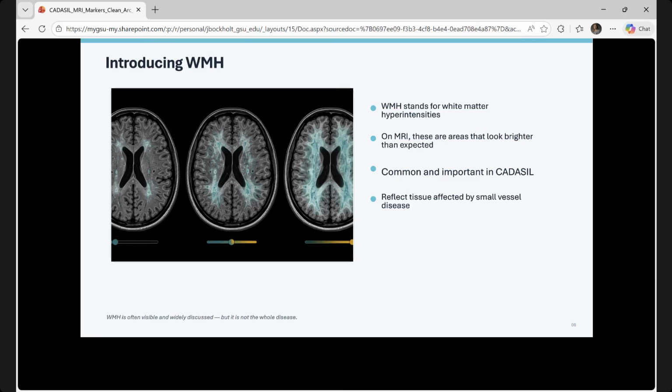So what we call lesions on FLAIR images look brighter where they shouldn't be bright in intensity value. And because they're brighter than what should be expected, various image analysis tools have either learned, been trained, or utilize AI to automatically or semi-automatically classify or create a map of where lesions are in the brain.